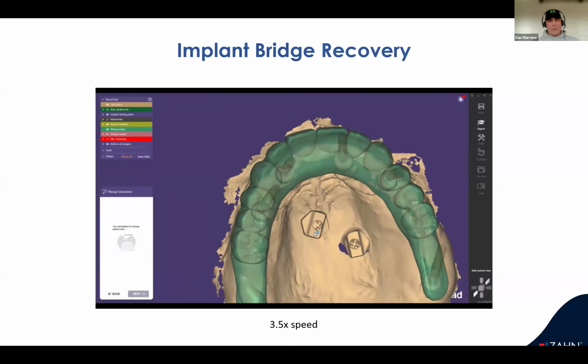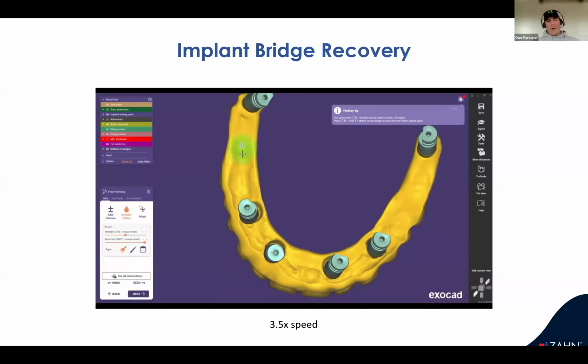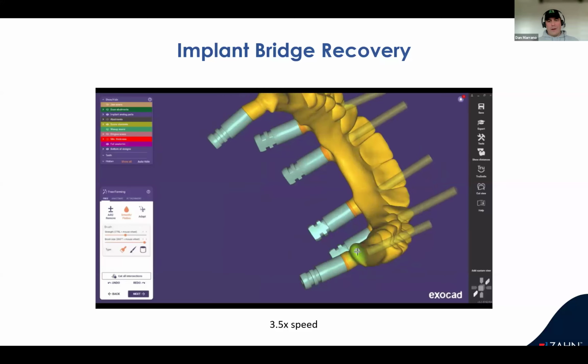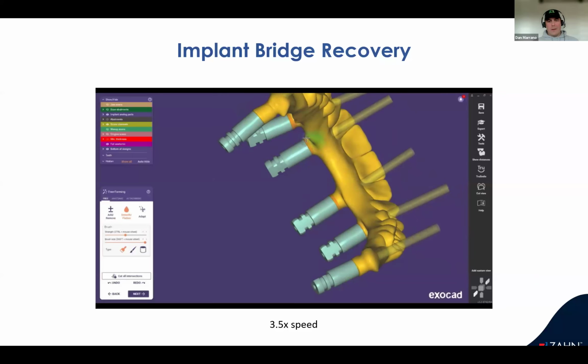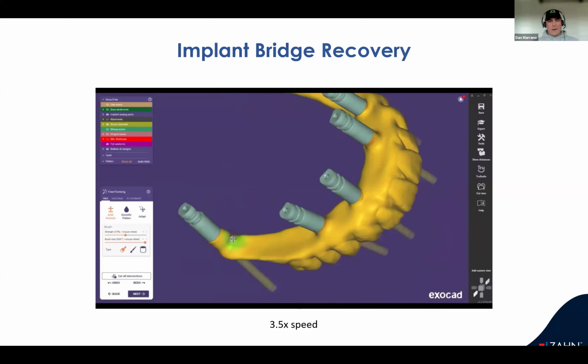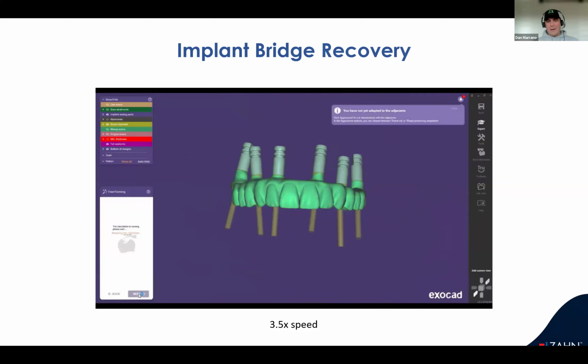I've had cases like this over the years that just foul out at an assembly stage or whatever it is, and then I just bring them into exocad and quickly run it through. That was like the longest you'll ever see exocad run, in my view. Here's the super smooth. For the sake of demo and time, I probably would have spent a little more time on this, but I just wanted to get it cleaned up quickly to show you some of the tools and how easy it is.